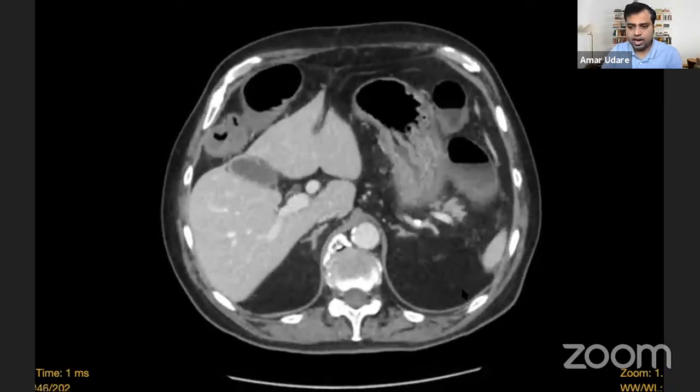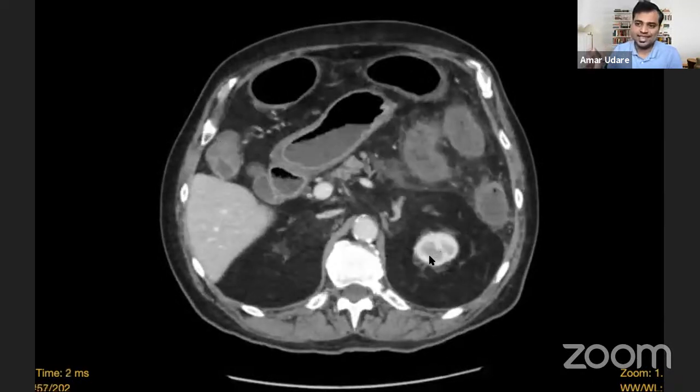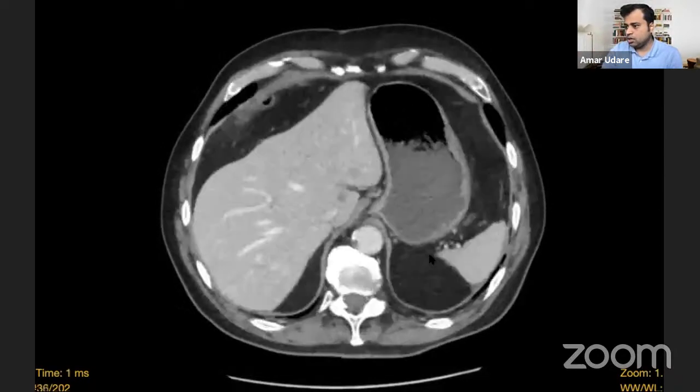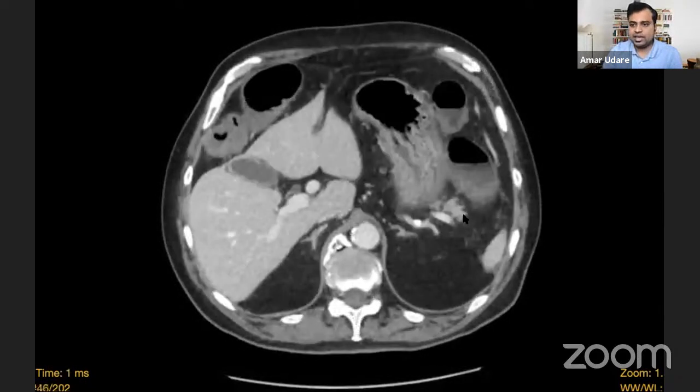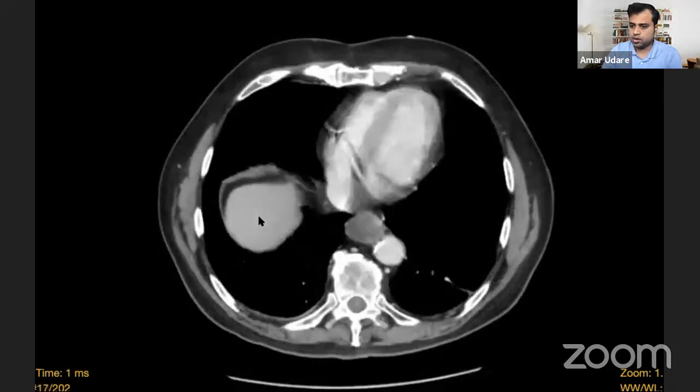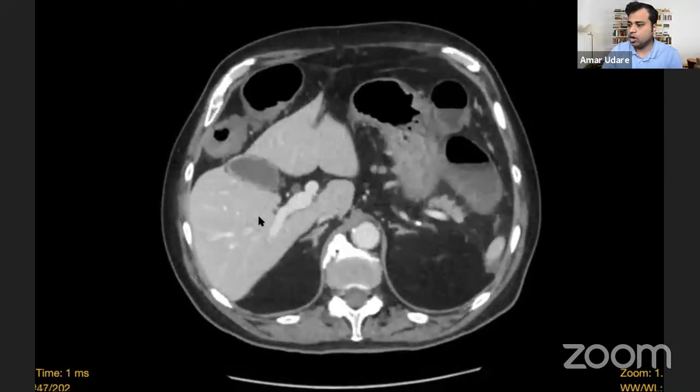So inferior mesenteric artery, probably. So the history that I gave in this case, so this patient has a myocardial infarction. So think on those lines. What kind of ischemic colitis you may see in those cases? This region of the bowel, is there anything particular about this? Atherosclerosis, yes, that's definitely a clue towards the cause.